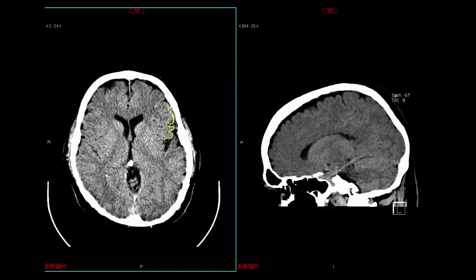And there's a couple important points I want to make about the inferior frontal gyrus. We know, at least for the majority of the people on the left side, this is going to correspond to Broca's area. And we know that lesions or infarcts or anything like that in Broca's area will lead to a non-fluent aphasia, sort of language issues in that case. So this is an important area to keep note of.